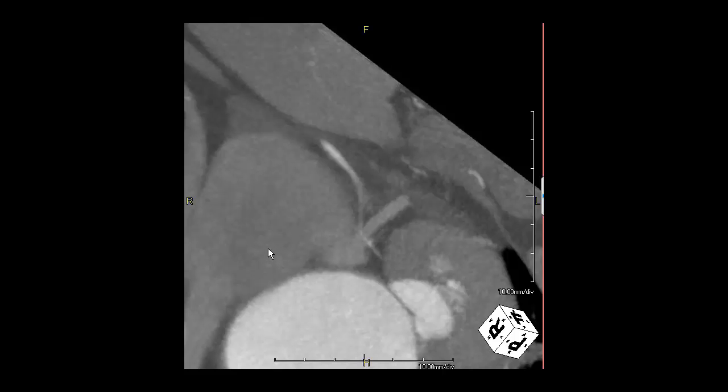So in summary, we have a 55-year-old gentleman who has a dilated ischemic cardiomyopathy, evidence of prior myocardial infarction, and currently has triple vessel obstructive disease and occlusive disease involving the right coronary artery.